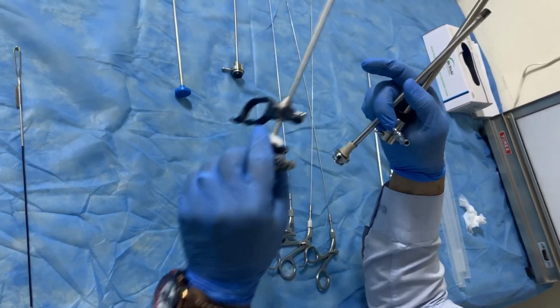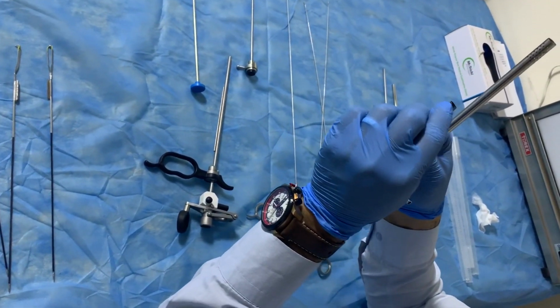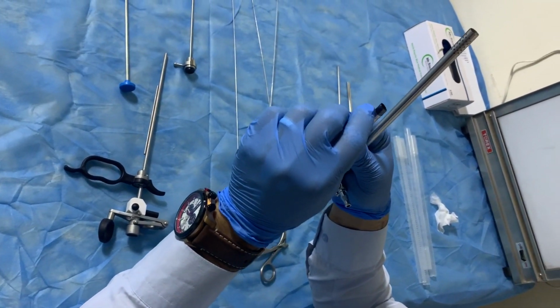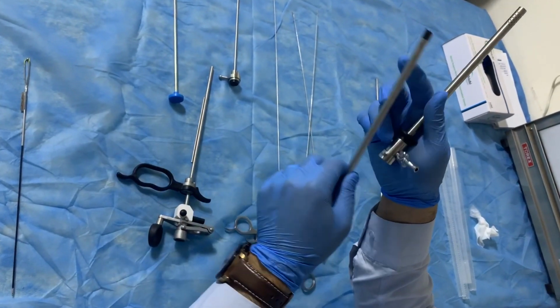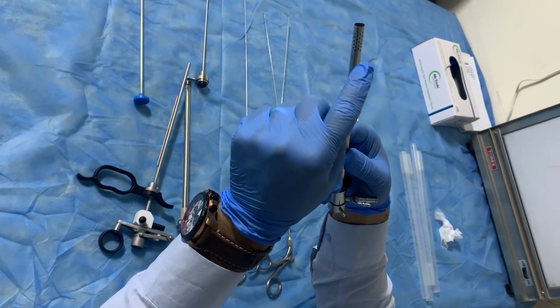So about this part, we have inner sheath and outer sheath. Inner sheath, it's insulated from here. Insulated from here to avoid transfer of current, which we occur during use this electrode. I will show you later. And this outer sheath contains many orifices for exit of fluid.